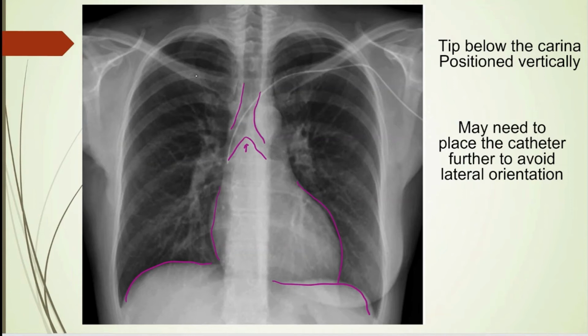Then E for everything else. Look on the patient's right side. Looks like you get good vascular markings. Patient's left side, good vascular markings. So you know you don't have a pneumothorax over there. And then look here at the line. You can see this line coming in here and across and down to here. So here's the tip right there. So you can see the tip is positioned vertically, which is good, just barely.